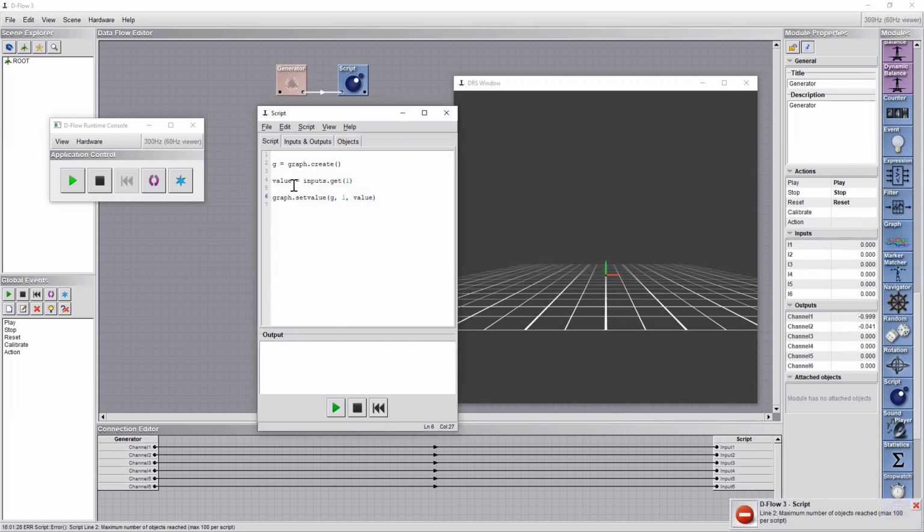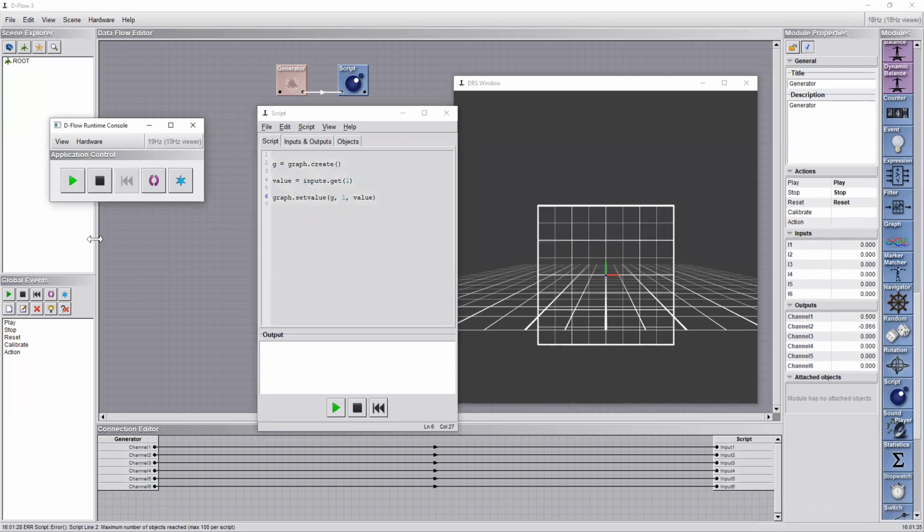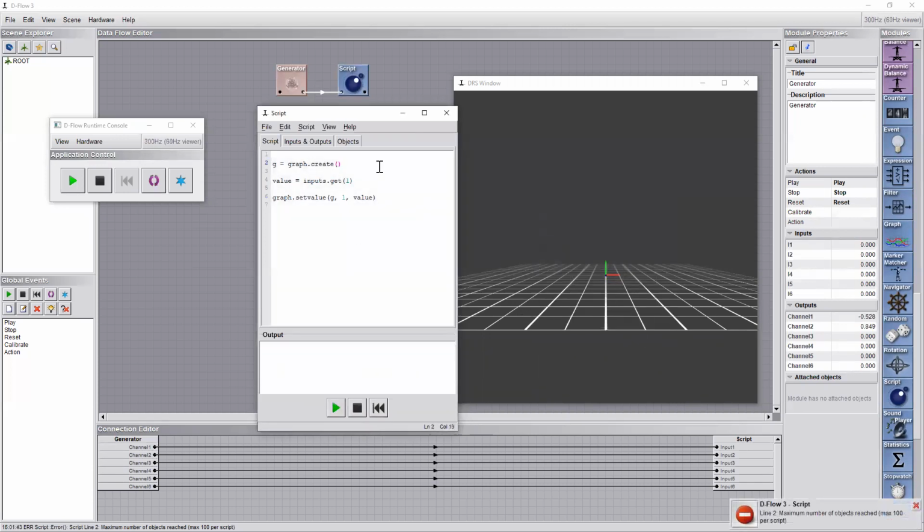At least here, running here doesn't run the generators. If you run it from the generator, there's something that's missing, right? So let's fix that one so that we can figure this out. We need this to be done just once. So we say, for instance, if, then, and end. There should be something here so that if, let's say, X happens, then this graph is created, and that's it. All right, and then we can say that the graph is created.